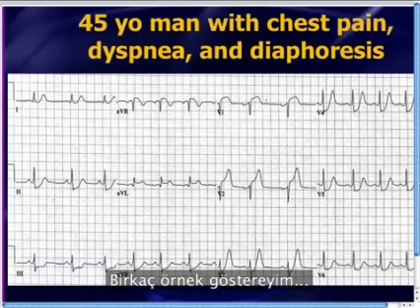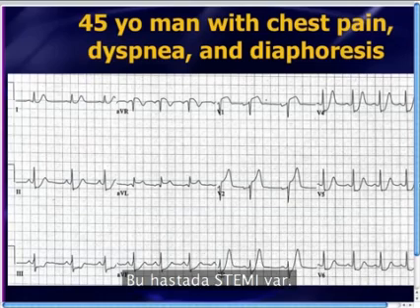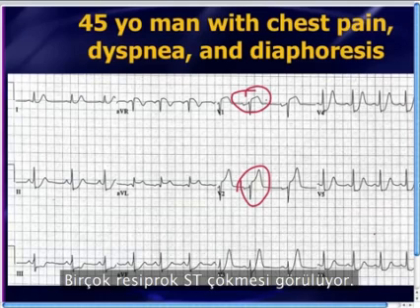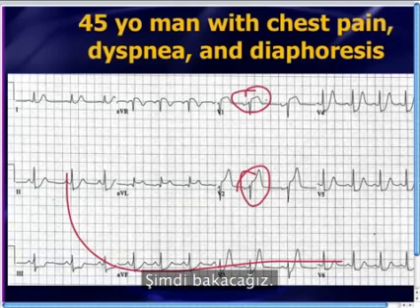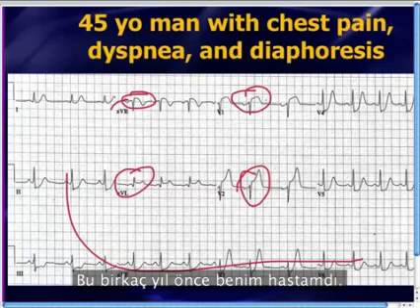All right, so let me show you a few examples here just to really hammer home this point. This patient is actually having a STEMI, ST elevation V1 and V2. And there's multiple reciprocal ST depressions, and now we're going to look up here, and there's elevation in aVR and aVL. What does that mean? It's left main. This was my patient a number of years ago when I was working at a community hospital. All we had was thrombolytics. I gave this patient thrombolytics.